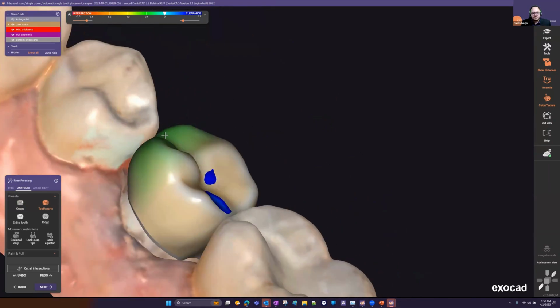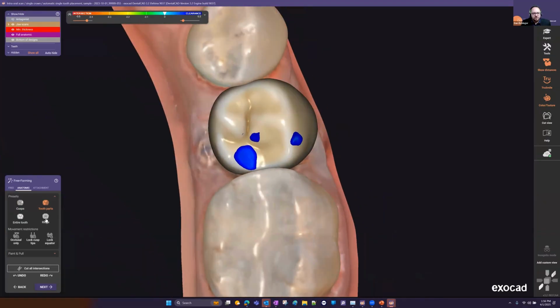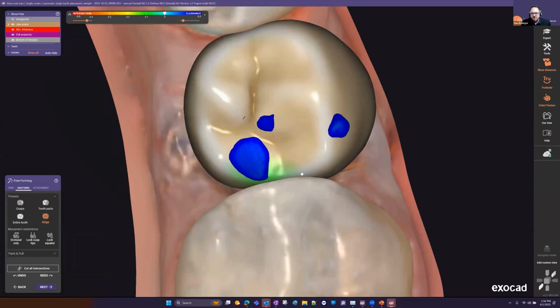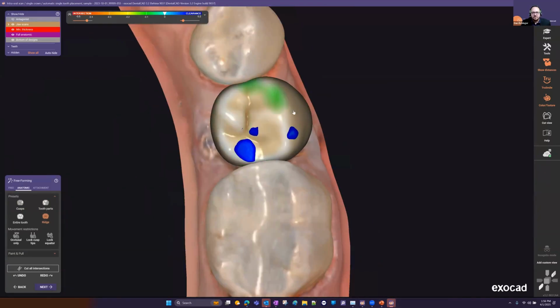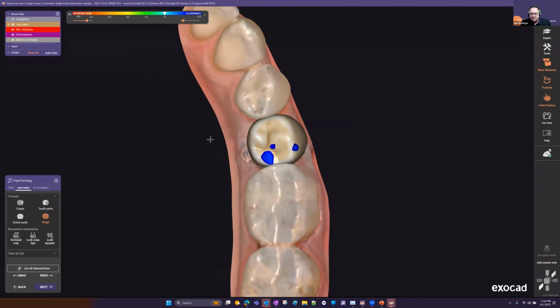So for instance, with grabbing and pulling material, it gives a lot more control, especially with ridge. So if you have really small areas, the tools that are put in place are really going to give you specific areas that allow you to not mess up your design, basically.